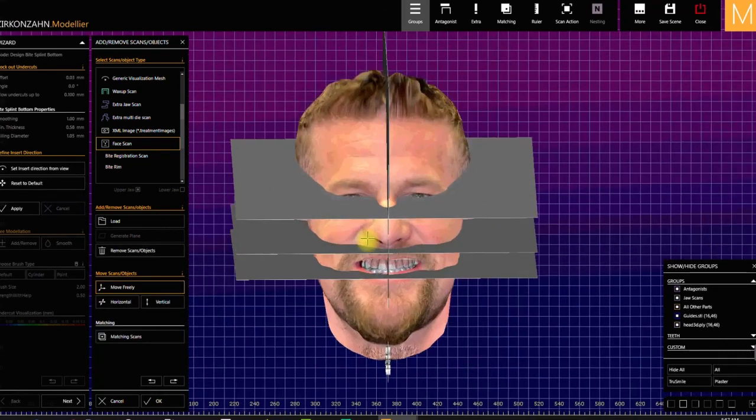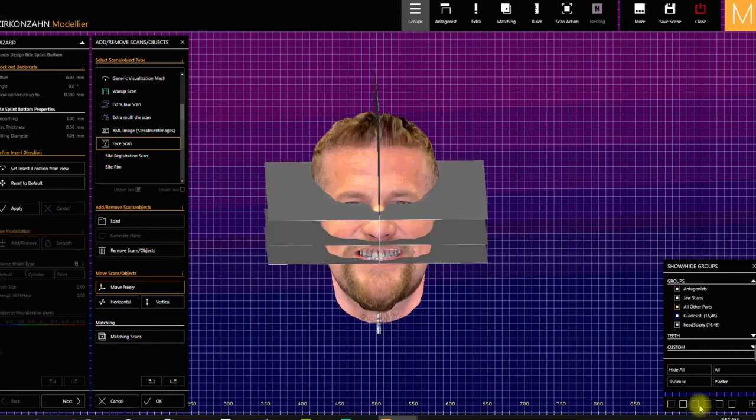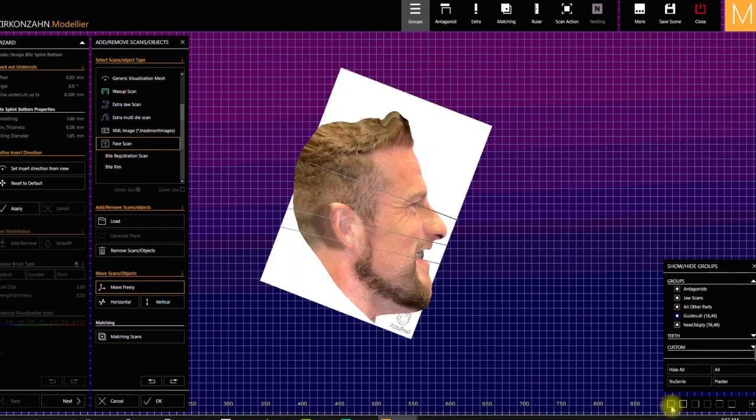And it looks like everything's lined up perfectly. You can come here and use all your little motion things, the Alatragus. One of these, it might be the guides from the other time I did my teeth. In fact, I think it is. So that won't happen to you if you're just doing one set.